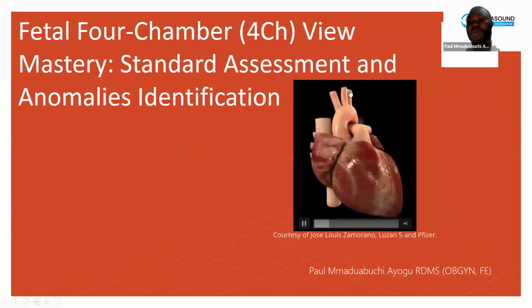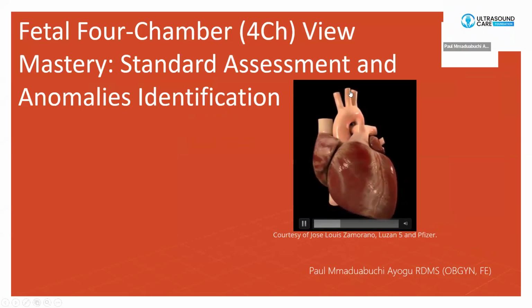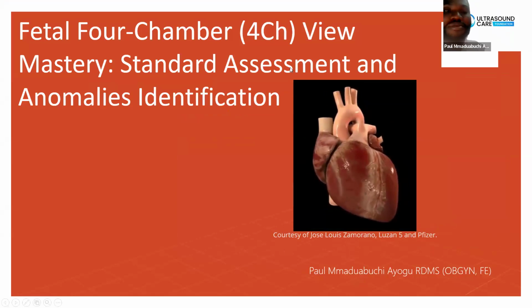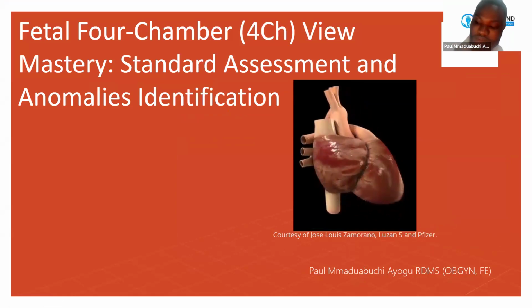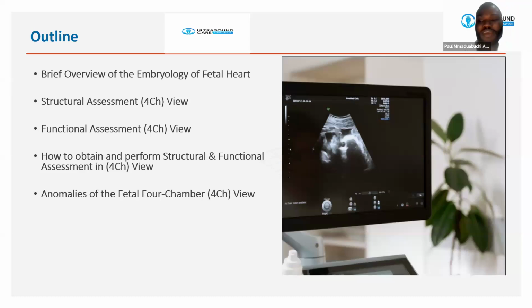All right, so I'll be speaking on the fetal 4-chamber view, the standards and the anomalies. I'll quickly move into the outline, where we'll be looking at an overview of the embryology, the structural assessments, and the functional assessments. We'll look at how to actually obtain these 4-chamber views with respect to your structural and functional assessments, and we'll look at some selected anomalies because of time.